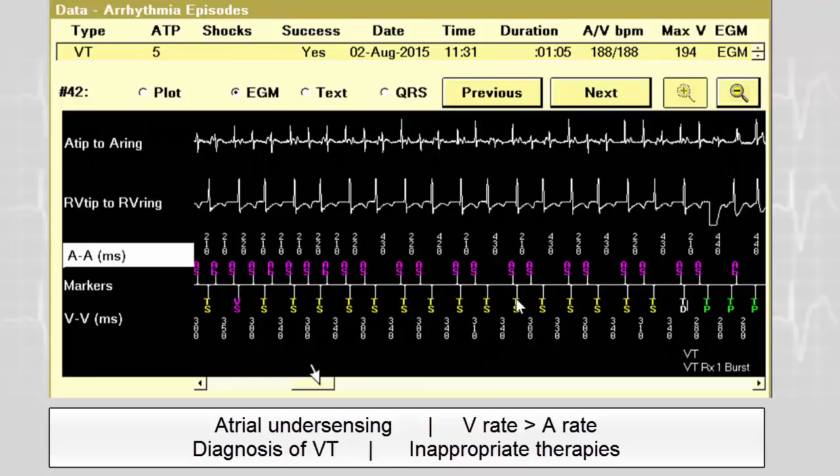So if in a patient there is a sustained atrial undersensing, you clearly need to deprogram the PR logic, which is based on the comparison between the atrial signals and the ventricular signals. And probably, in a patient with atrial undersensing, you need to program only the wavelets, and the discrimination will be based on the analysis of the morphology of the ventricular signals.